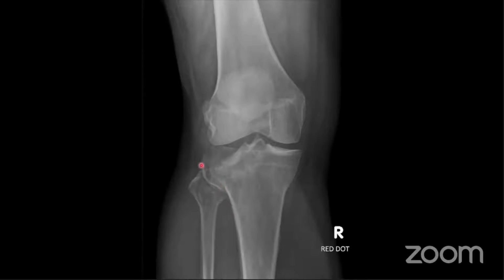So again, there's a step here, so this is obviously a fracture, but sometimes you just see a slight change in trabecular pattern, which makes you think that there is a fracture. Sorry, I don't know if my internet's not really clear. But you can always compare it to a normal side, or if they have a previous X-ray, you can see how it looked before.